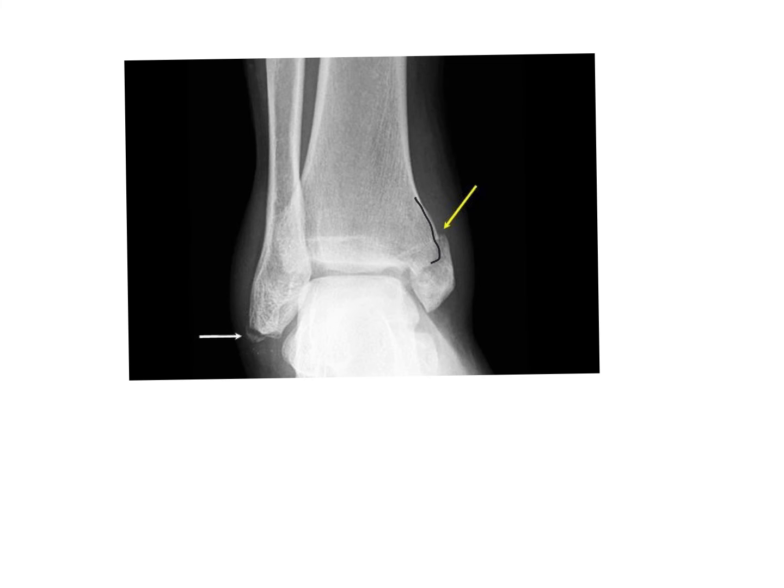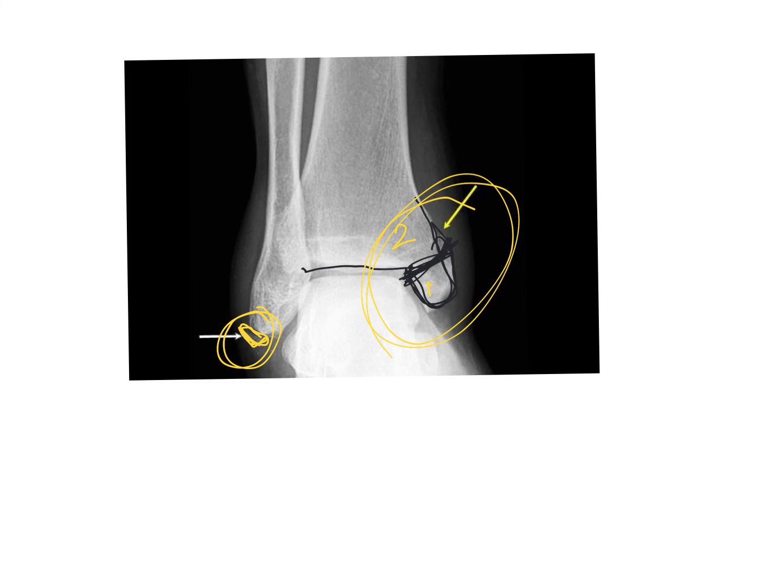Here we have the base of the tibia, and its little basically protuberance here, which is actually the medial malleolus, has broken off right here. And again, we see more of a kind of transverse fracture happening, but the main terminology to use here is going to be avulsion. This is an avulsion fracture. It can also be termed non-comminuted because it's resulting in only two pieces. So one piece here and then another piece there. And I'm sorry, we also have another one here that's also an avulsion fracture. We can see just a tiny little bit here has been broken off.